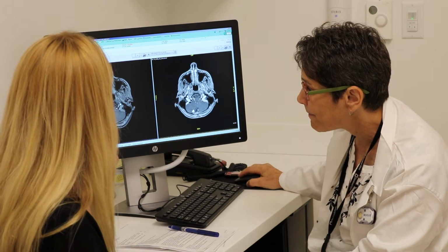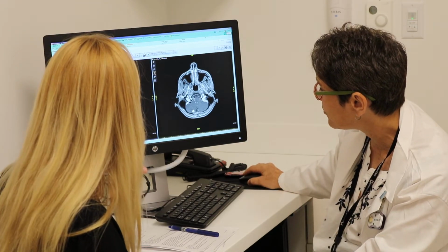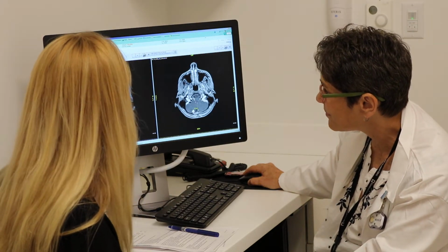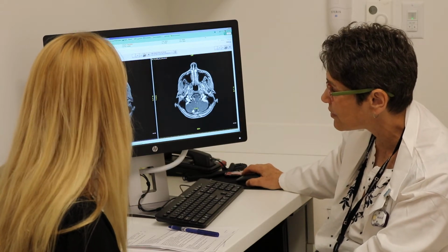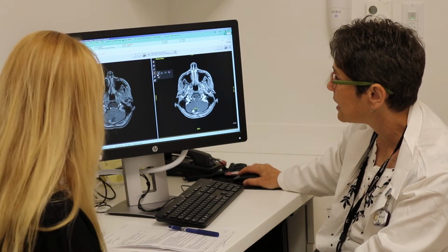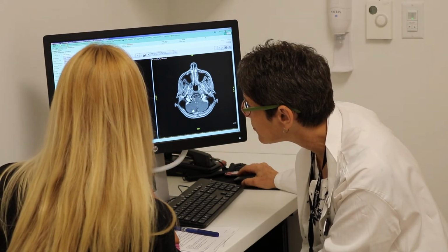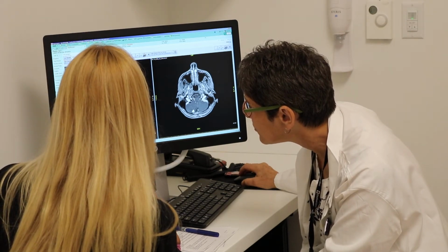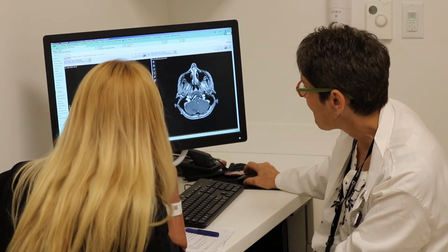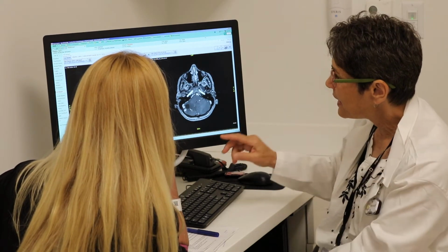So the 4 other brain tumors I have, are they staying stable? Right, the other 2 are so little. This one, maybe it's 7 millimeters, maybe a little more enhancing in there, a little bit brighter, it seems to me. The other ones on the other side are just so tiny and they have not changed at all. There's one there, and there are 2 of them right there. They've always been there, and they're just not growing.